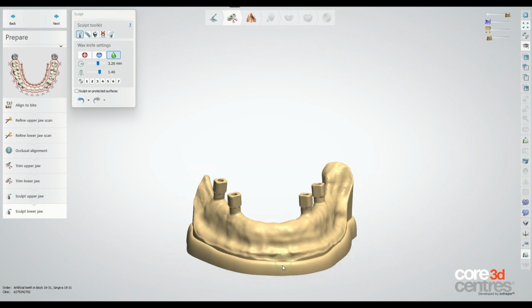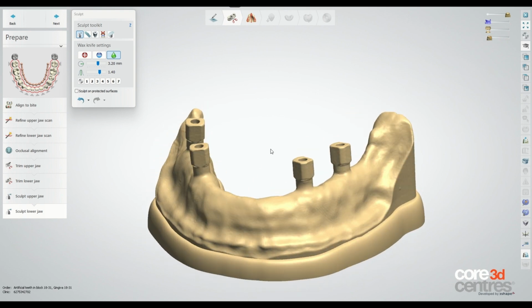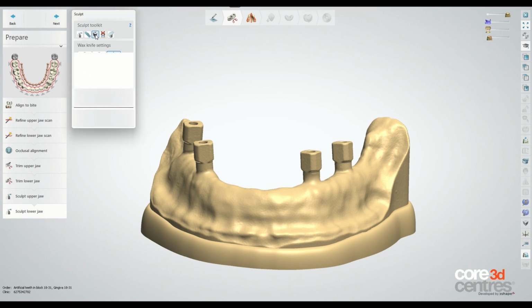If you will be designing a denture with the straight PreatLoc abutments, select the jaw with the scan bodies and click on the attachment icon on the Sculpt toolkit. In Group, select the correct implant family. In Attachment, select the gauge option with the type of scan body and implant combination the clinician used when scanning if the cuff height is unknown, or desired cuff height if it's known. Then select the Surface Normal option under default orientation. Lastly, ensure the 1x1 checkbox is marked.